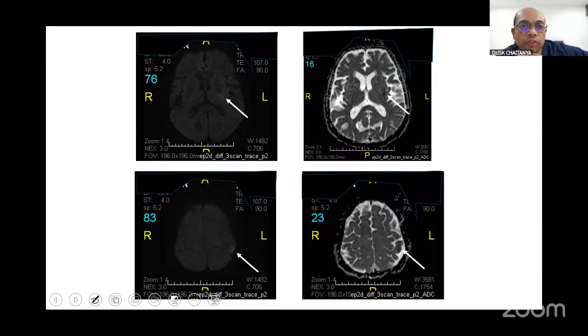So this is an elderly patient who came to us with a wake-up stroke. Very early, the first CT was not showing much, but the patient had dense right hemiplegia. When we did an MRI and diffusion imaging, we could see a few areas of diffusion restriction. For these small, tiny areas, the patient was densely hemiplegic. Because that was a wake-up stroke and we could not find the timeline, we could not decide on the time whether we need to thrombolyse or not. These corresponding areas were black on the ADC, apparent diffusion coefficient mapping. So these are definitely areas of acute ischemia.